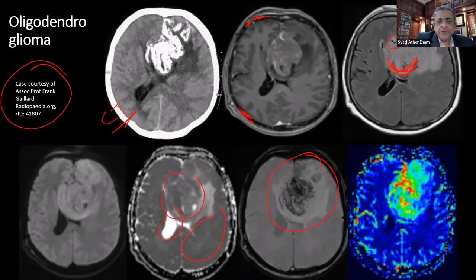CBV, or relative cerebral blood volume, rCBV also. And there are different methods of it, there are so many complexities now, mind-boggling. Anyway, what it shows is whether the blood going into this region is a little higher. It does look like there is a little higher blood flow in this region, and that suggests. If it was, let's say, a dead tissue, then it would be much darker, like the ventricle here, which appears dark, right?